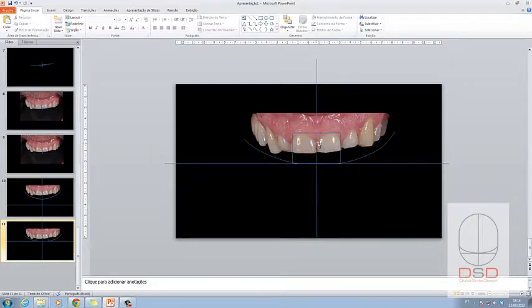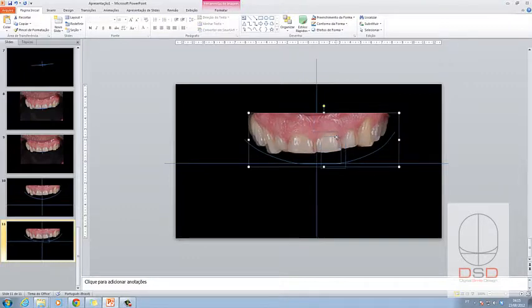Now, this is our start. This is how we would start the process. This mainly, if it fits the design of the tooth here, it is going to really work. You can see that it's a little bit off here, so we're going to make it a little bit bigger, and I erase the other one because now I'm going to duplicate with the new dimensions.